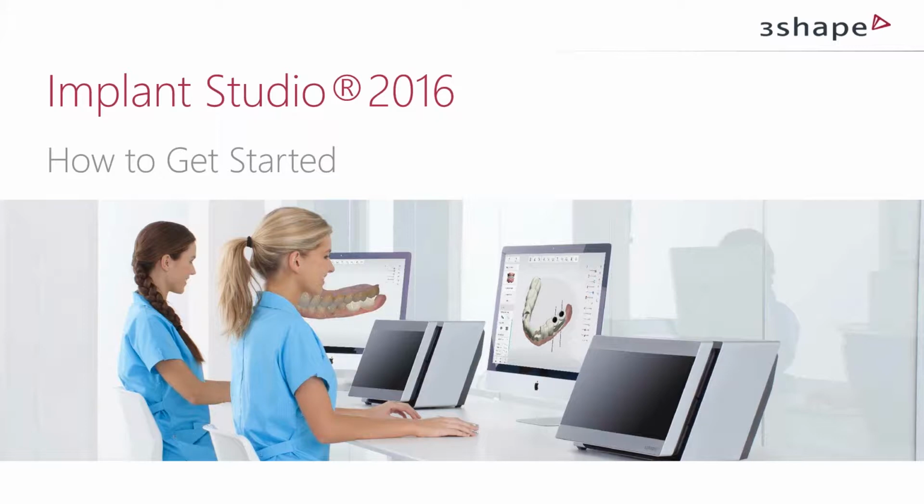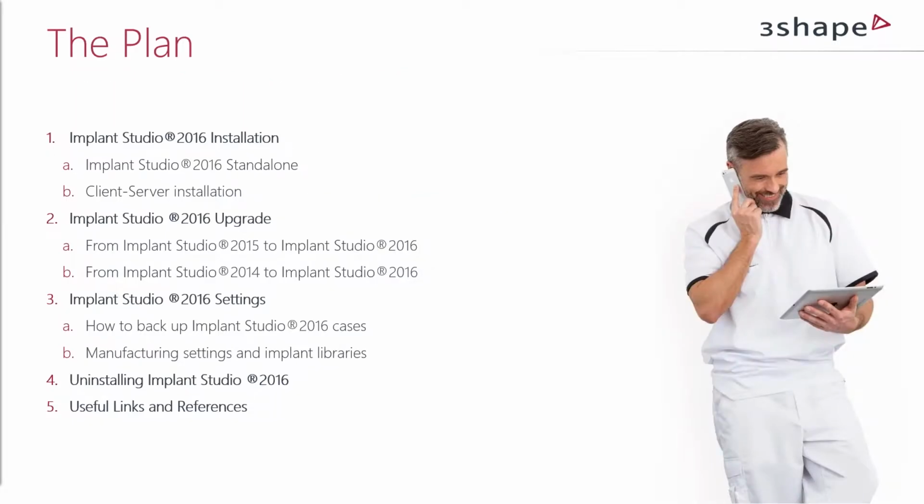Hello everyone. One more time, welcome to our webinar. Today we would like to go through the installation process to see how we can install Implant Studio as a standalone and also as a client-server installation. Then, of course, we will see how we can upgrade from the existing versions to the latest version of Implant Studio. And then we will talk about how to set up the software, how to back up cases a little bit, and also how to uninstall it. So today is more technical but general information about the software so we can start using it.